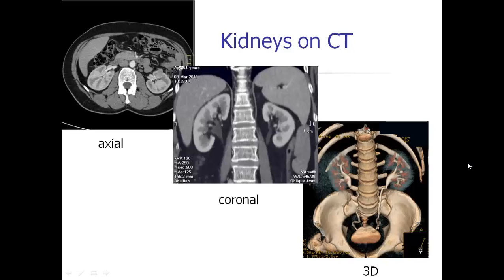Here is the presentation of kidneys on axial and coronal slices of CT and on three-dimensional reconstruction.